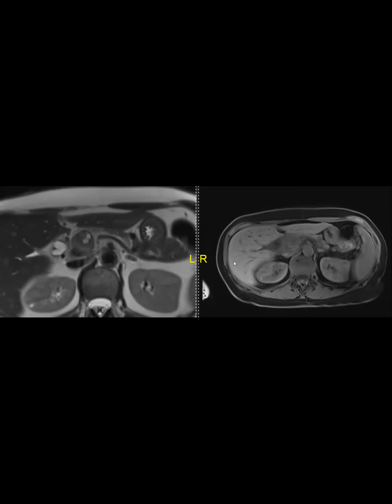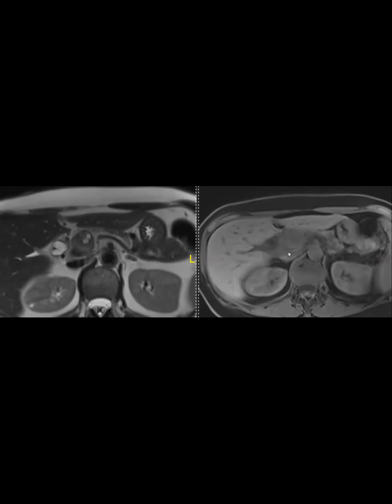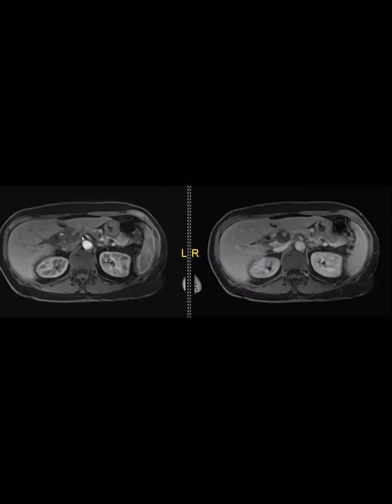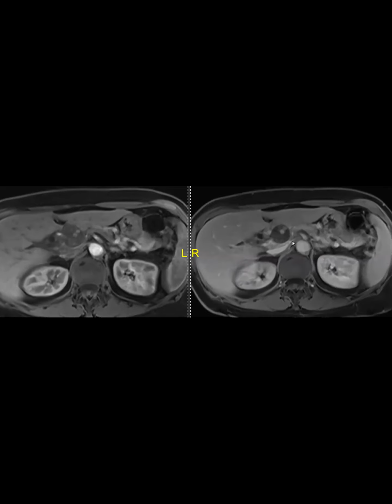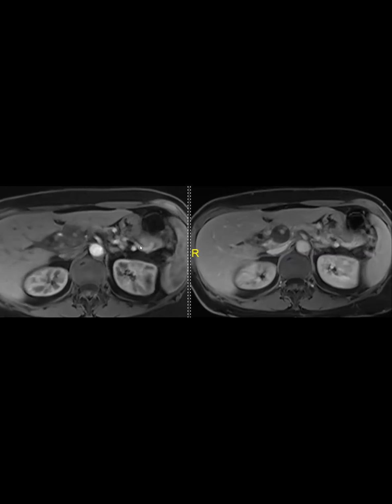At this point, the patient was told that she has pancreatic cancer. Victoria, one thing I'm thinking about with those cystic spaces is a paraganglioma, because I know they can have cystic spaces. Right. So wait, hold on a second. Before we give the differential diagnosis, here's the post-gad. Oh, I see. They're not cystic. They weren't bright, right? Right.